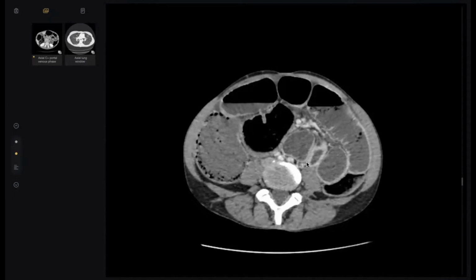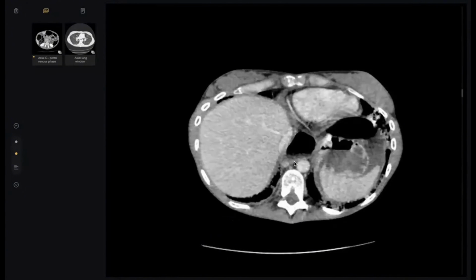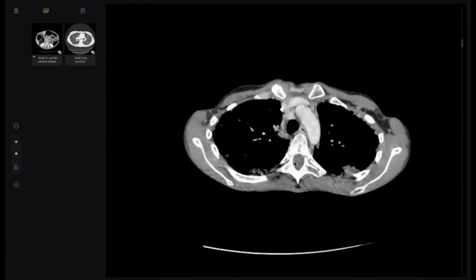What is the cause? Because of the atrophy of smooth muscles, because it affects the smooth muscle contractility. Infiltration or affection of the smooth muscle. Okay. So we see this gross dilatation of the GIT and the lower end of the esophagus. Thank you, doctor, so much. A classic case of multisystemic scleroderma.